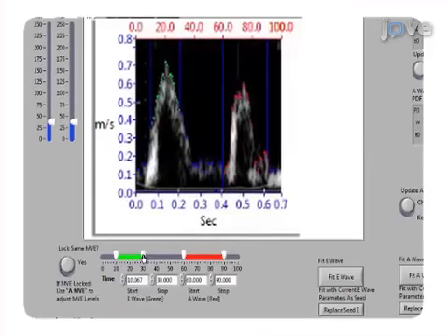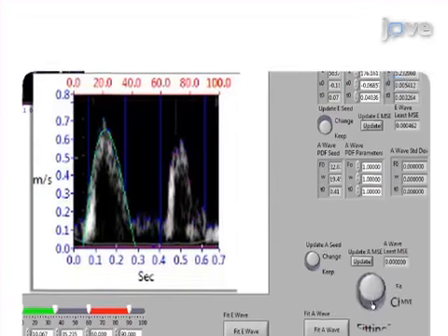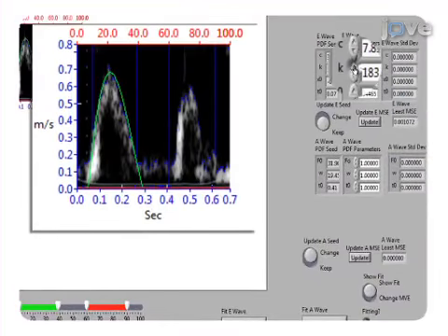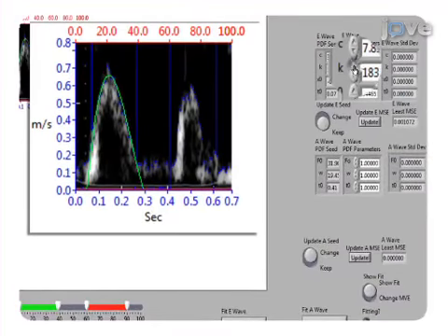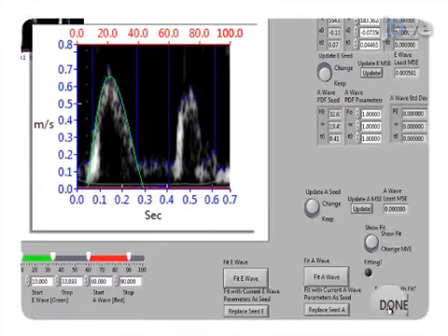Next, the pre-processed transmitral flow image is loaded into a semi-automated fitting program. A segment of the E wave is selected for fitting, and a preliminary parametrized diastolic filling model is produced and overlaid on the image. The final step is to refine the fit if necessary and have the program generate the final parametrized diastolic filling model based parameters for the input E wave.